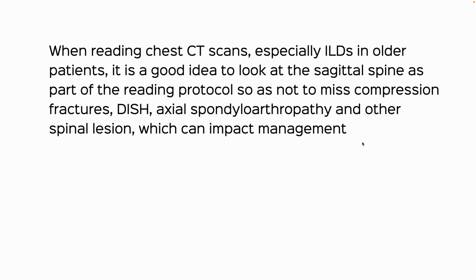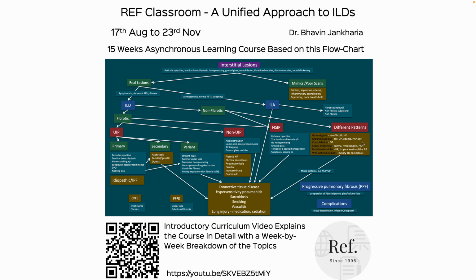That's the way I do 5 things at the same time. If it's an ILD, obviously if there are no prone images or expiratory images, then you just open the volume inspiratory lung window, soft tissue window, and always the sagittal spine. That's the course.